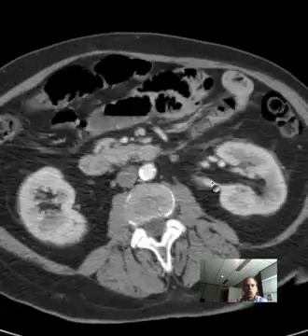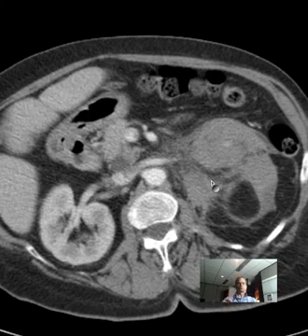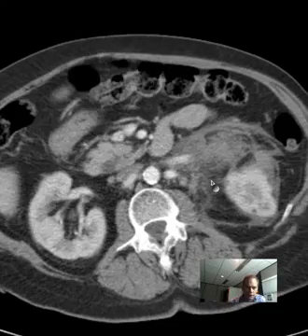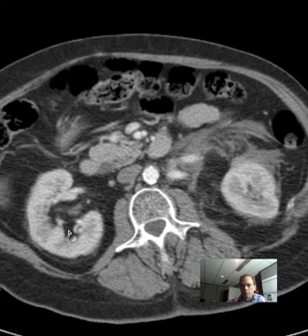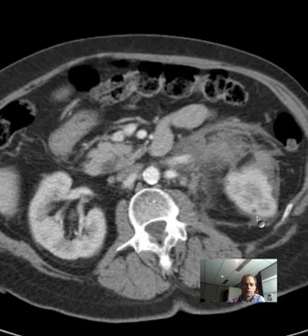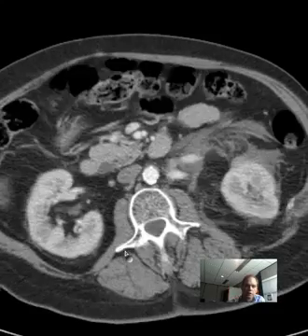Okay, so what is abnormal? There is an abnormality. What's abnormal? You kind of find yourself sometimes lost with where to begin. So the space that is involved is the retroperitoneum, and I think you can see that very clearly here. You see the kidney is a retroperitoneal structure. It is in the perirenal space. And you remember that there's an anterior pararenal space and a posterior pararenal space.